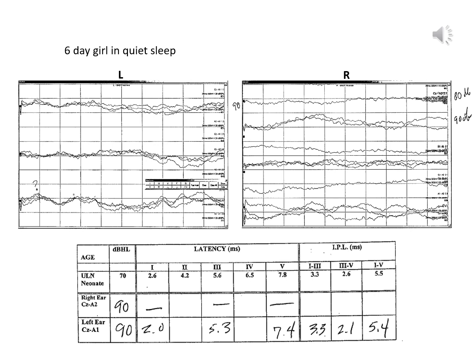Then they moved to the left ear, starting immediately at 90 decibels, and there's possibly a wave 1, but it's very, very poor. And so they did several replications at this decibel level, and so we might possibly be able to identify a wave 1, 3, and 5. Coming down to the numbers, the technologist has written down the numbers for the left ear, which is appropriate to do, but there are no numbers for the right ear.